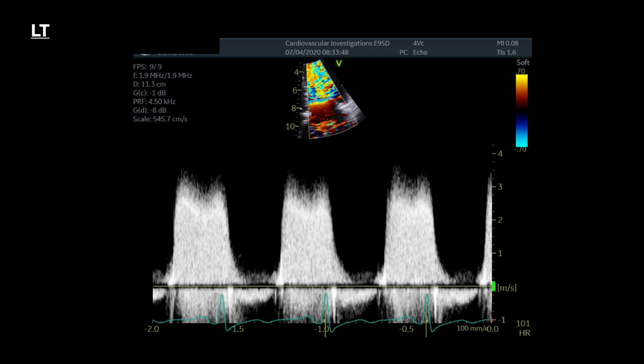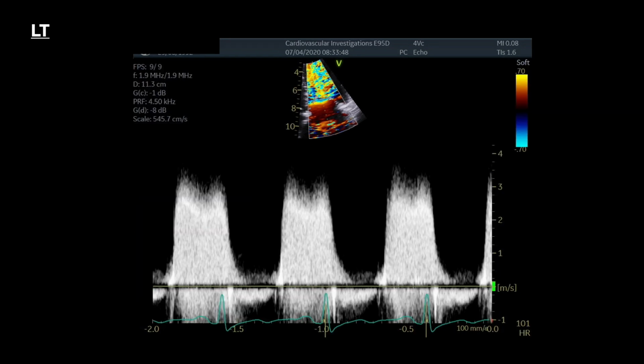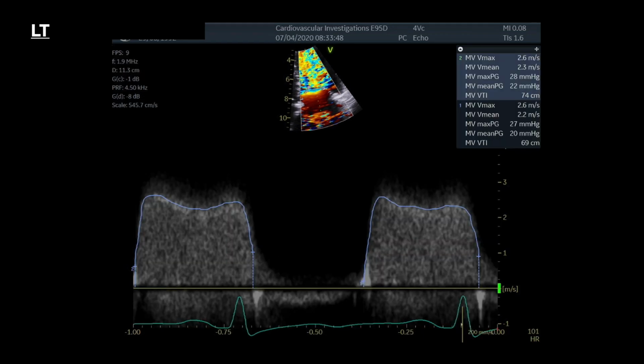So this is looking at mitral inflows. Similar pictures, but this is the raw CW of mitral inflows. And what they have done with this image is optimize it a little bit. They've slowed it down, changed the scale a little bit and reduced the gain. The way that I was taught is that you want to trace the chin and not the beard, so you want to avoid getting all of those little wispy bits at the top. In that way, you'll get the most accurate representation of the mitral valve mean gradient.